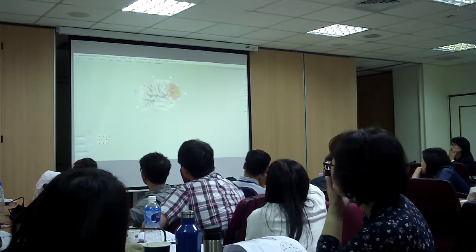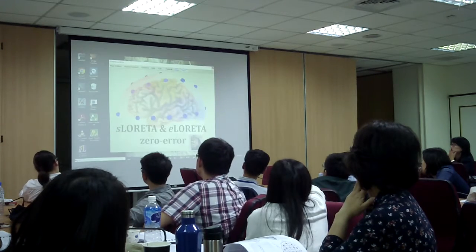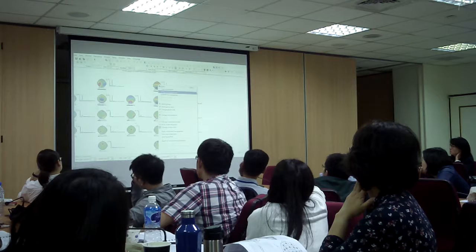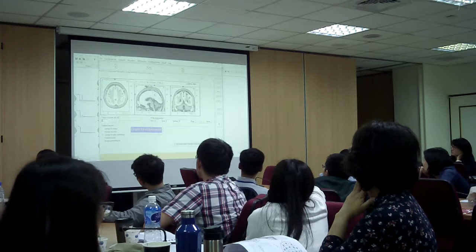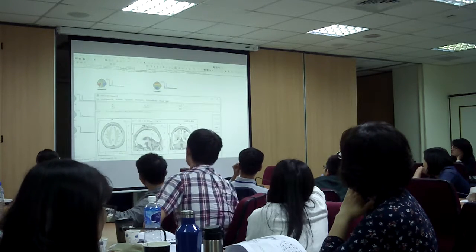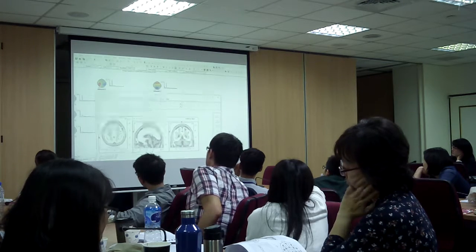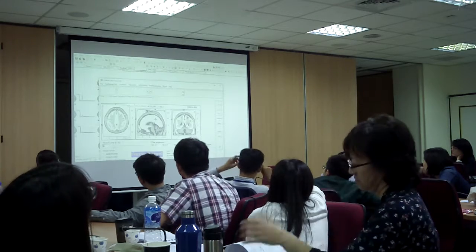Now I'm going to do the same for the other topographies. So I'm going to close this here, and I'm going to go here, and right click Loretta for components, and there we go. So see how interesting that is: you see the activation at the front, but see where the source is? That's going to be Brodmann area 7 probably. Oh, 31. There you go.